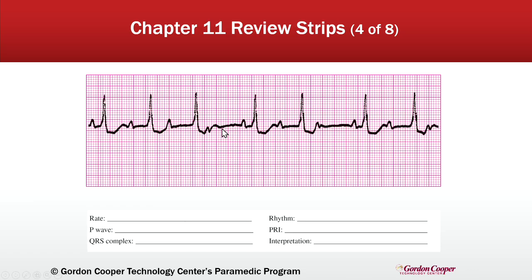So it's progressively getting longer, that PR interval. So that looks like a Wenckebach. What do you guys think? Second degree type 1 Wenckebach. And I'll let you do the rest. And that's blocks for you.